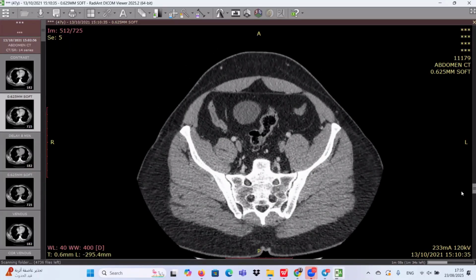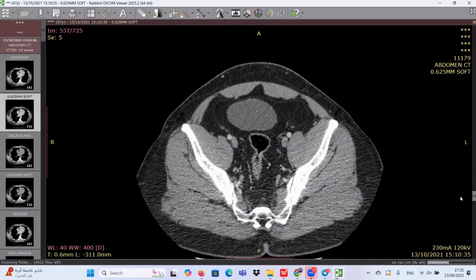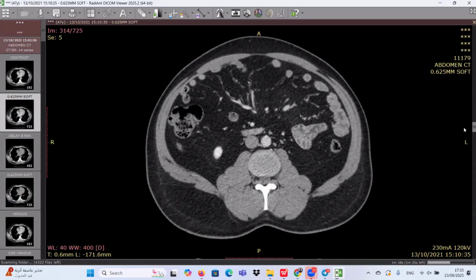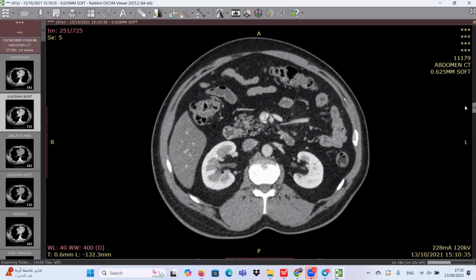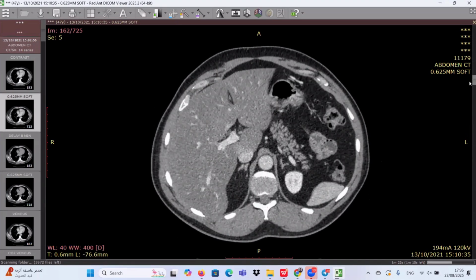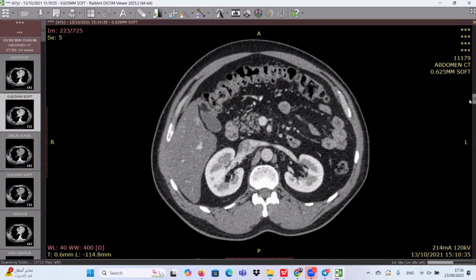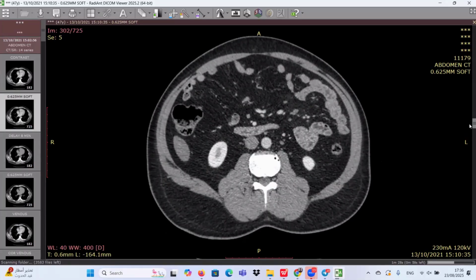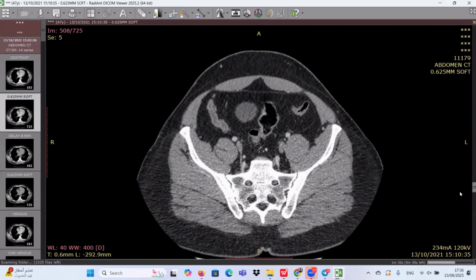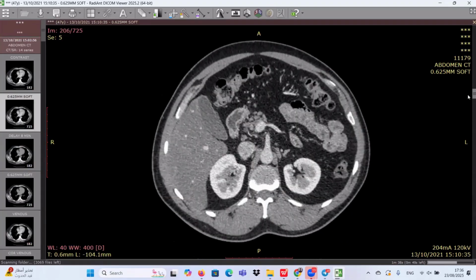I'm unable to find any pathology at the moment. I think I did like you said, because really I couldn't appreciate a gross abnormality, but when we discussed with the clinician at once at the table, he said that the pain is more localized to the left side, maybe left groin pain, maybe left iliac pain, something like this.